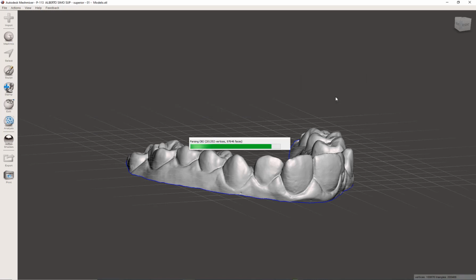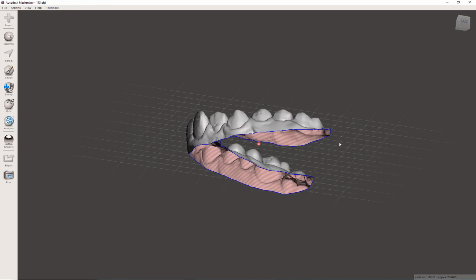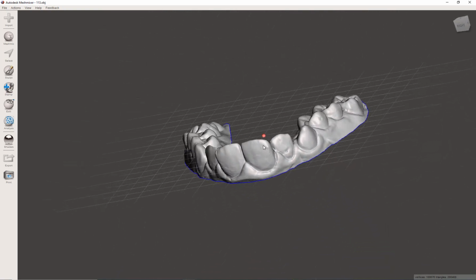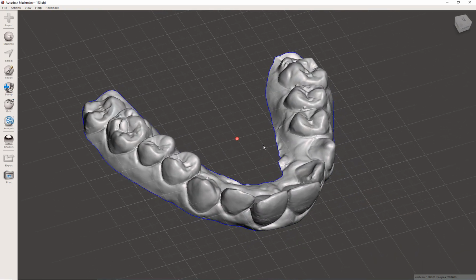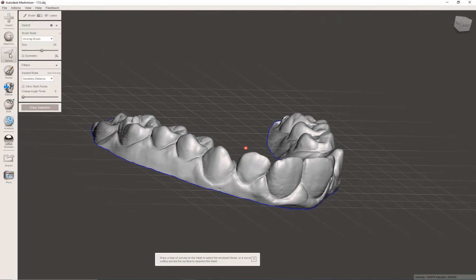We can replace whatever we have on screen. In this case, it's a 3D scan of the arc. This is the traditional kind of mesh that you would receive. It's only a thin surface with a hole below. So what we want to do is make it solid.